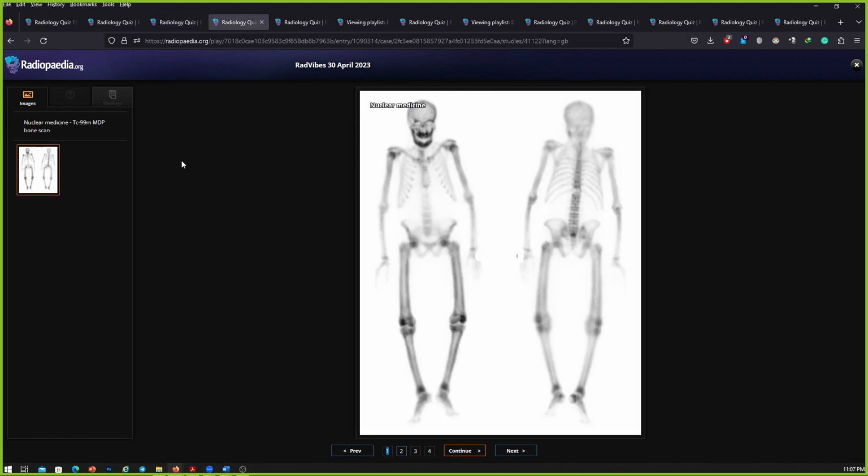Okay. So this is your next case. Okay, I'm presented with a bone scan, delayed images, anterior and posterior view of an adult patient, where I can't see any shadow within the kidneys. Sorry, there is no uptake within the kidneys bilaterally, which indicates a super scan.